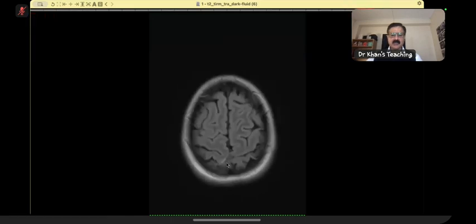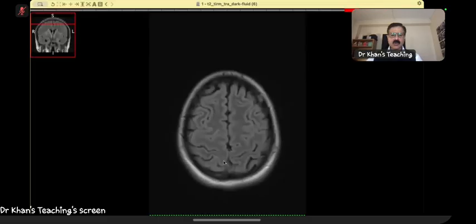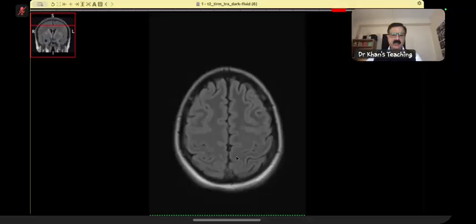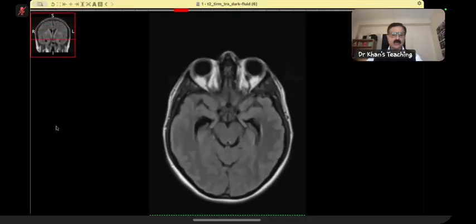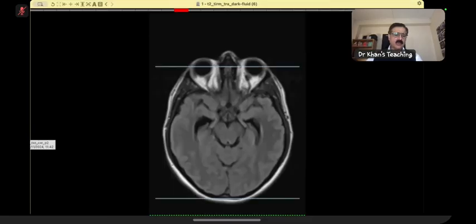If it is high signal, it is either blood or, in this case, a clotted cortical vein. If I just give you this FLAIR, I want you to pick this up. Other than that, as you have pointed out, on the DWI sequence there was nothing significant, just a few specks of restricted diffusion.